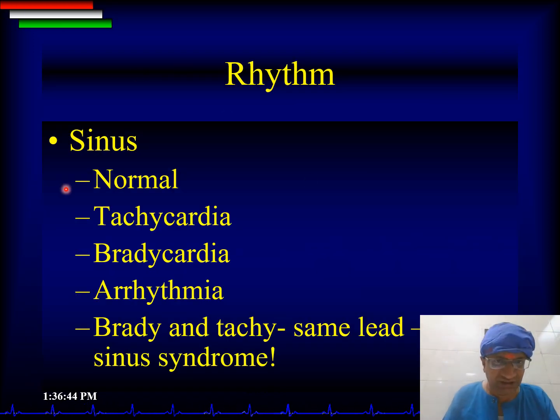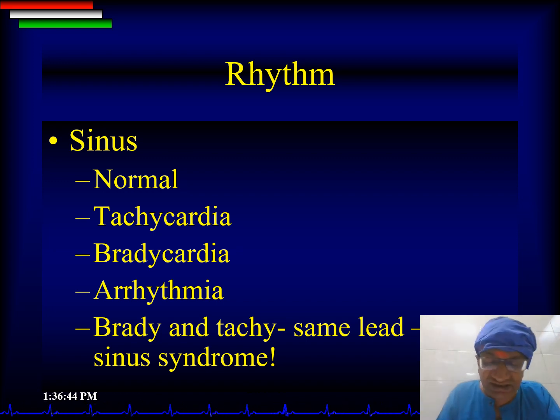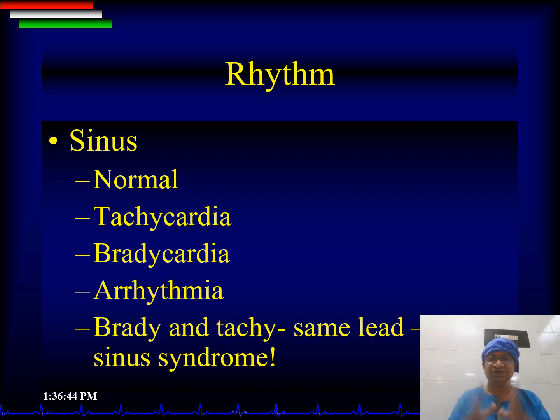So what is the rhythm? Normal sinus, tachy, brady, arrhythmias. Brady and tachy sometimes in the same lead may be sick sinus syndrome. Yes, these are all clues. That doesn't mean sick sinus syndrome should always have this. Same lead, brady to tachy, sinus.